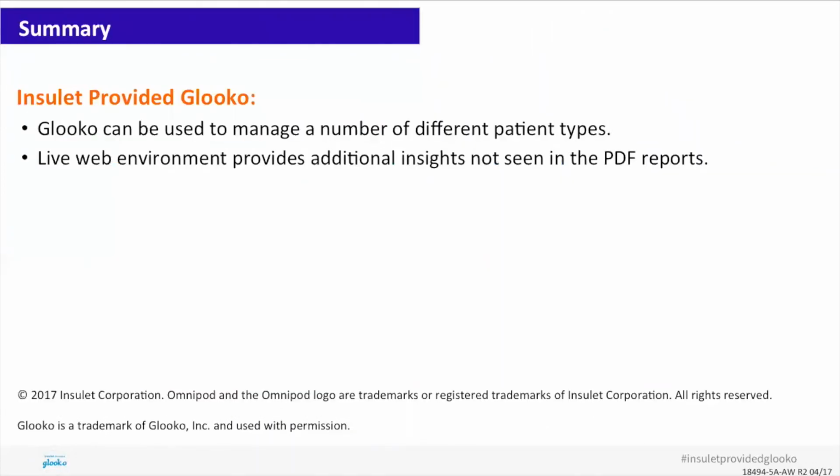So I hope you're able to see a number of different ways that the reports within Glooko in the live web environment can be utilized to manage different patient examples. Our hope is that this presentation has helped set you up to become a better Glooko data management expert and understand the system's functionality. Thank you for your attention.